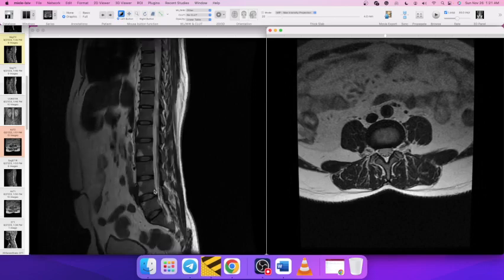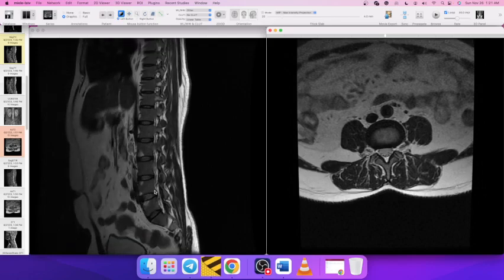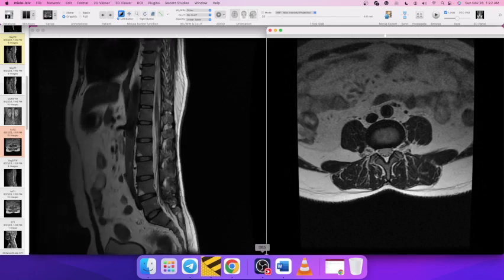Now, this child did not have any history of ankylosing spondylitis, but in ankylosing spondylitis, we might see straightening of the vertebrae, sacroiliitis, and these corner lesions. So that definitely is in the differential. And yeah, thank you.